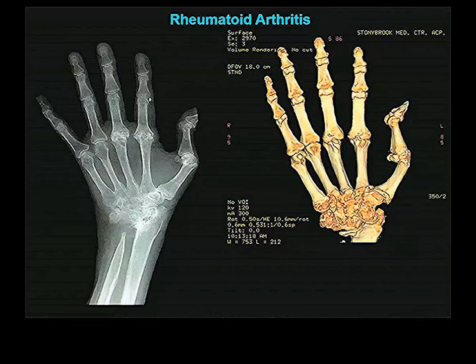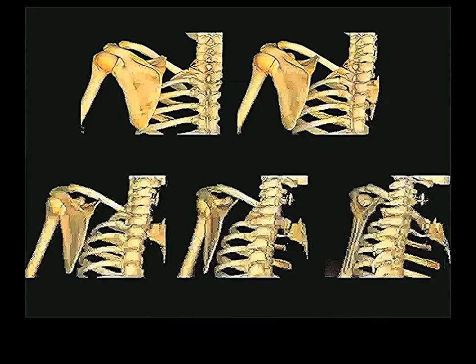So this is an autoimmune disease, and it just eats at your joints like they were butter. And these bones are all fused with one another. This person had a totally immobile, probably painful wrist. Look at the disease, it's even eating up the distal end of the ulna here. There's no ulnar head. There's nothing left. There's nothing you can do with this person's wrist. I don't think you can replace it with anything. I don't know. It's just hopeless. And you also see the disease has affected the metacarpophalangeal joints as well. It's a very bad disease, rheumatoid arthritis.